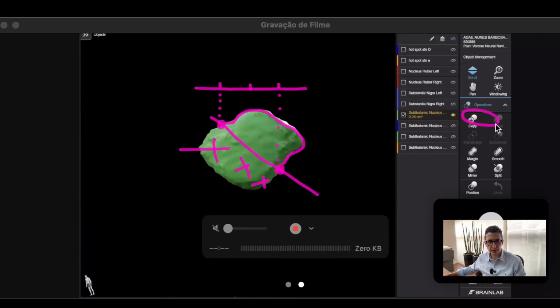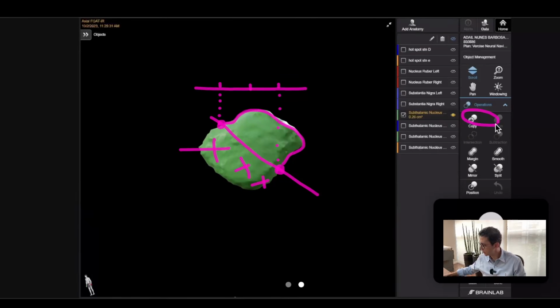As you can see, there is a split, and you are going to click on split. And once you do that, you are going to get your finger, and then you are going to point here, for example, or here, and then you're going to put here again to do this line.